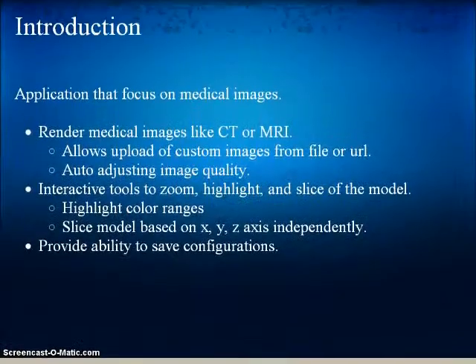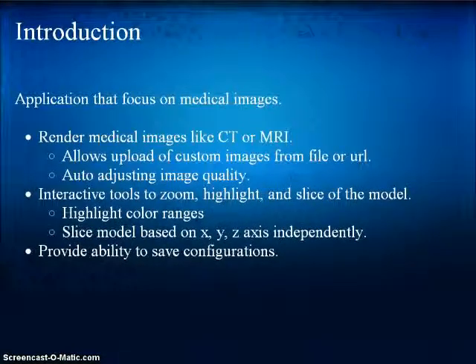Hey everyone, so today we'll be doing a short demo of a project we worked on called MedIPA. As most of you know, getting access to your medical image that's taken from the hospital is a huge pain right now. MedIPA aims to resolve this problem by providing the necessary tools to allow medical professionals to upload medical images like MRI or CT scans to the internet. This opens the door for a patient to be able to see his own scans as well as consult other doctors for opinions, an online collaboration tool for medical images, so to speak.